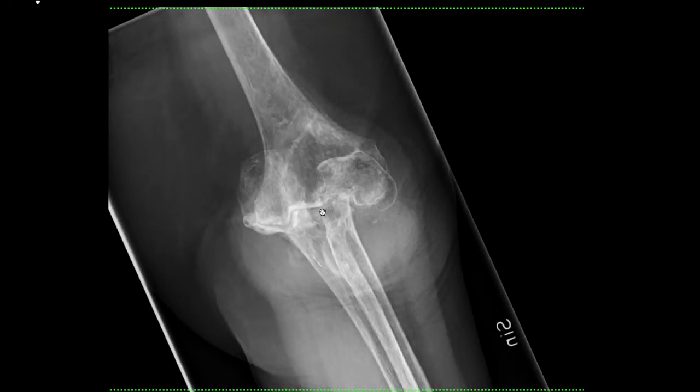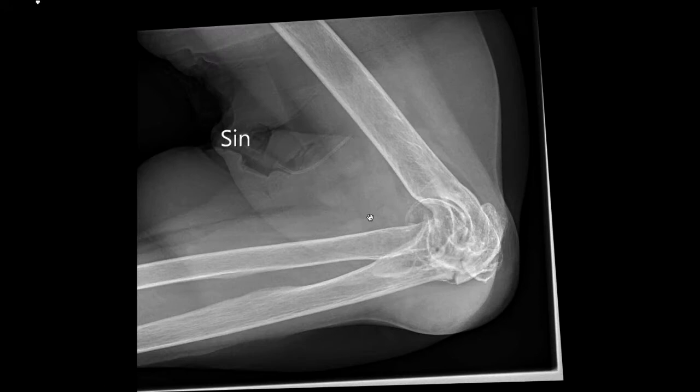Alright, the next image is here. And the first thing you see is a really bad narrow joint, because of long-standing arthrosis. It looks really ugly if you ask me. But this patient fell, had really bad pain. And you can see that there's a fracture here, boom, in the ulna, in the olecranon. So you made your diagnosis. You're a really good guy. And look here, there's a needle, a butterfly needle.